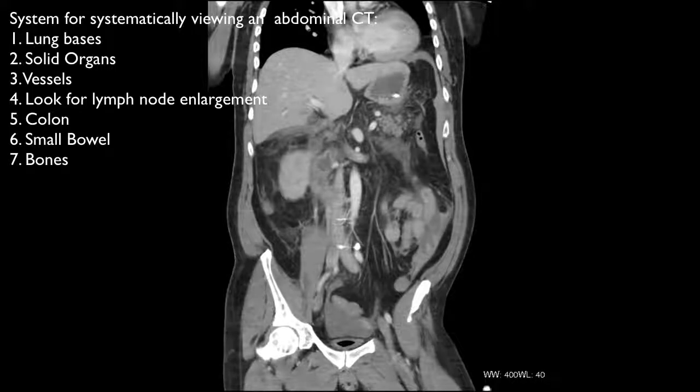and look at it in multiple planes, particularly sagittal and coronal planes for the bones. And again, with acute abdomens, it's very important then to look through for free air, and whilst you're doing that, you can look for some free fluid in the pelvis and around the liver and spleen. There are other little things you might want to do depending on the clinical information.